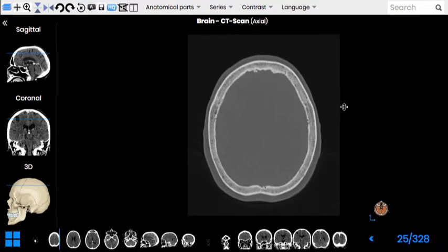Going a little bit ahead, I want to give you some useful tips on how to differentiate the CT scan from the MRI scan in a few seconds without thinking a lot. You just need to look at the bones. The CT scan is using X-rays, as well as radiographs. That's why bones are already opaque in this method, and they always appear white on images.